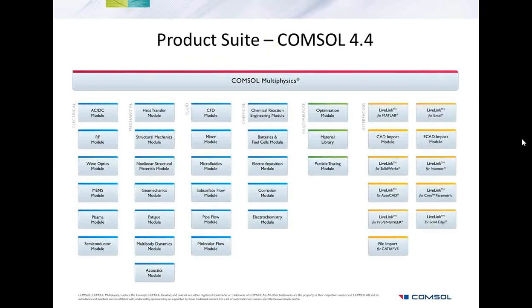With our particular case, you can actually use two types of methods. Either you convert your CT scans or your patient-specific scans into STL surfaces, so you define the outer surfaces of your bone, between your soft tissue or muscle and the bone. You import those STL files as 3D geometries, and then implement the mapping, which is the grayscale Hounsfield units that I mentioned earlier from your CT scans, and you overlay your density distribution and your material properties into your 3D domain.